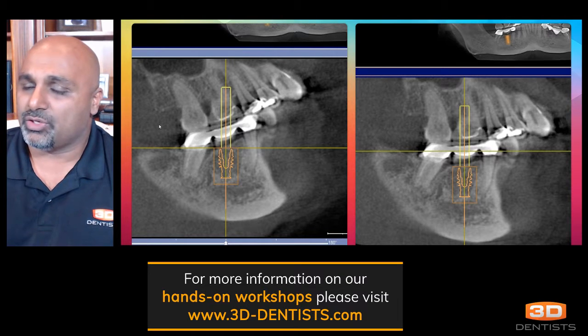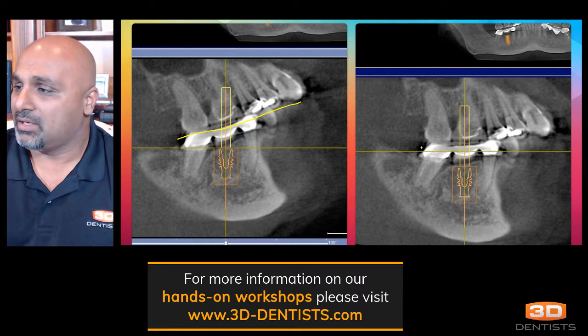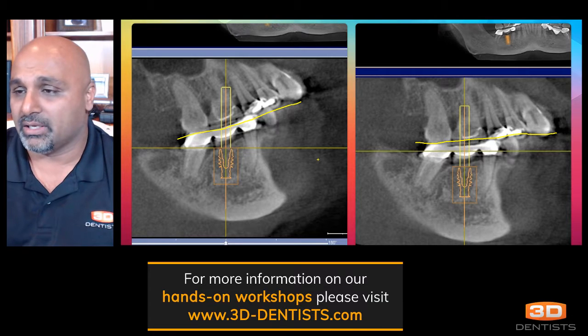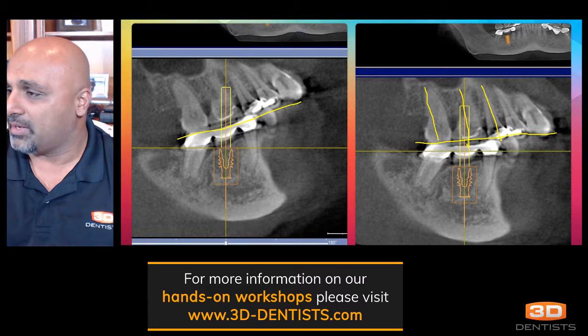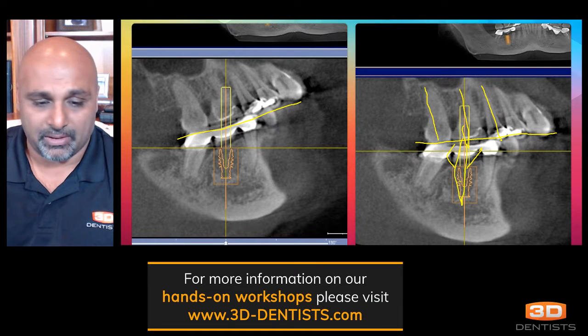So one of the things you can look at here is, again, the difference in the occlusal plane here versus here. It's literally not even 1 minute. Honestly, it's a 10, 15, 20 second fix to be able to create more ideal long axis occlusion onto our implant to minimize bone loss. And then again, a much better emergence profile.